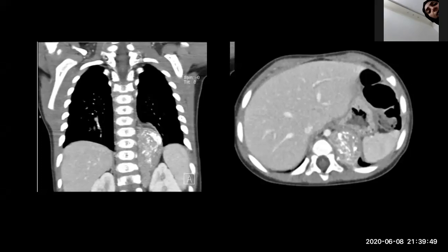And these are the most likely differential diagnoses, as we said before: neuroblastoma, schwannoma, neurofibroma. But with such an appearance, most likely it is a neuroblastoma. Be more specific and confident. Yes, because of the calcification and paravertebral location, most likely it is a neuroblastoma.